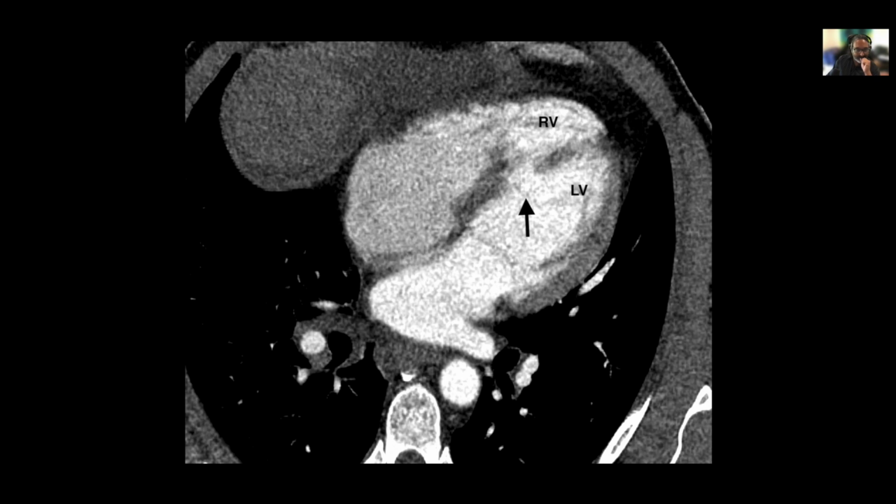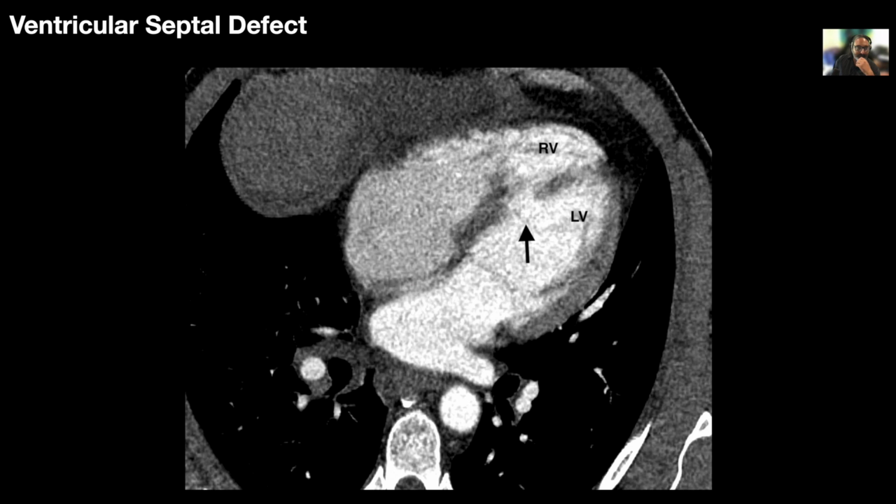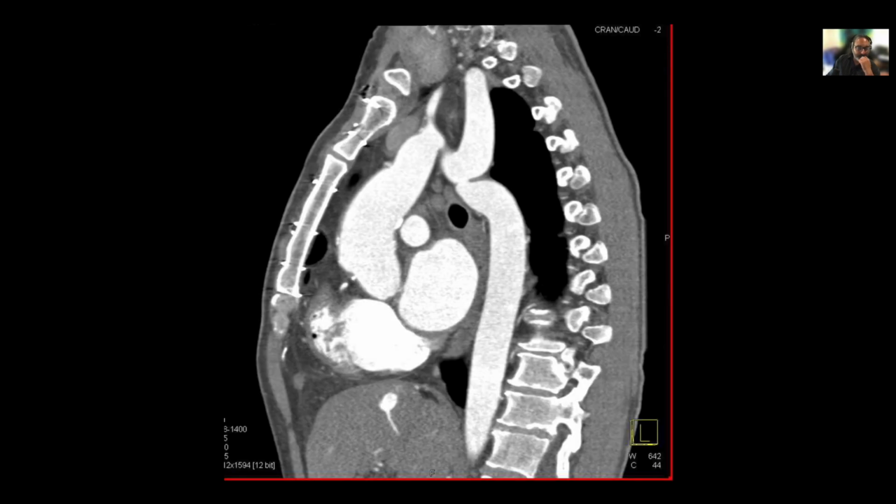So probably a ventricle. Yep, that is a ventricular septal defect. Correct. Good job. What is this? It would be an aortic coarctation. Yeah, coarctation of the aorta, absolutely. And that's how it shows up. Is there two? I can't say, actually. I'll have to scroll forward and back. I think when I took this image, I wouldn't know, so it's either there or there. But it is a coarctation.